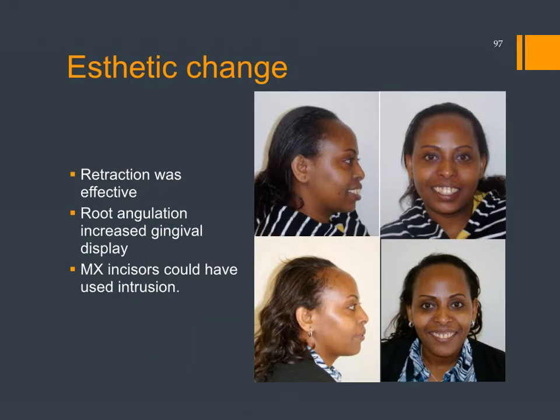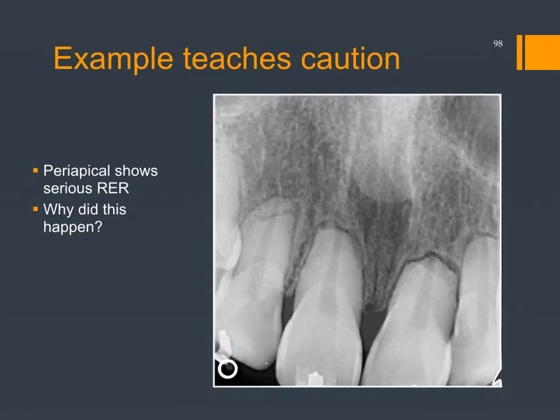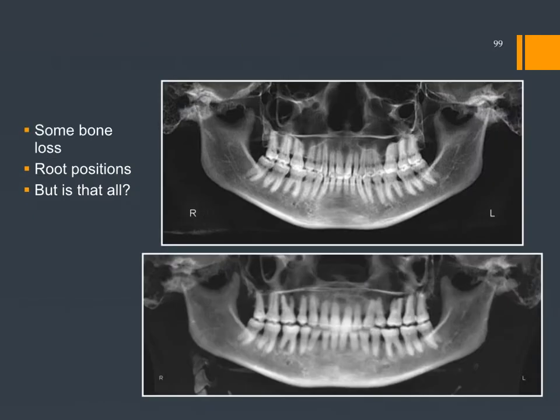But she was happy with the appearance, the change, but again, I just feel like the upper incisor position is problematic. The other issue is she had some pretty severe root resorption. And one of the things we know about root resorption is when you move teeth into the cortical plate where there is no vascular supply, it's a problem. And I think the roots will cave before the cortical plate does in a lot of cases, or at the same time. So I think in this case, that's the reason she had so much root resorption. She'd had a little bit on the lower, but not as much.